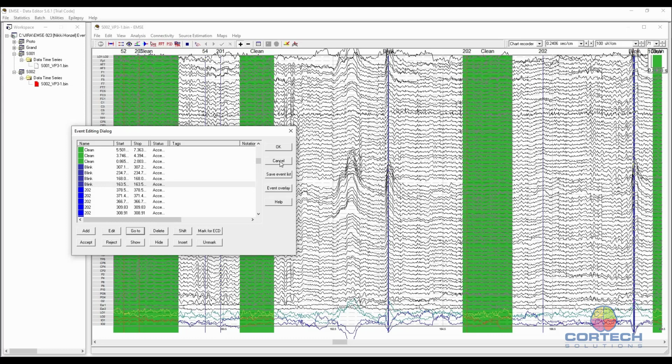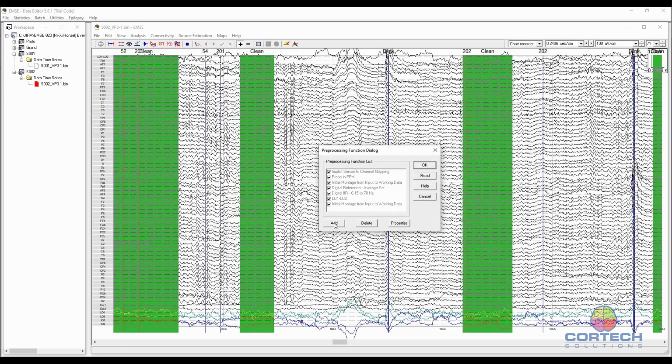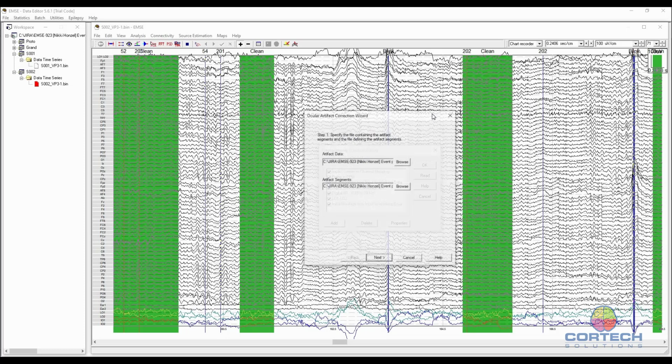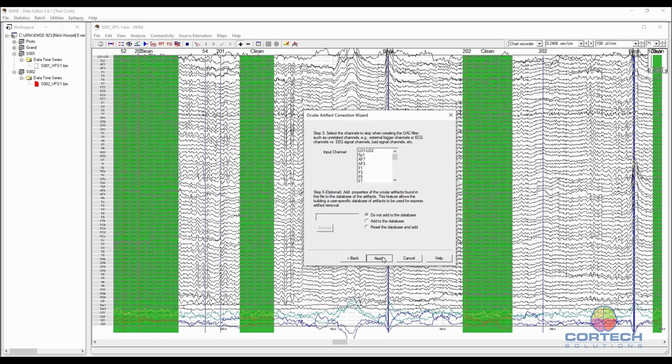Let's go ahead and do correction here. I think it's debatable whether we need to do that, but I'll go ahead and do it. And just like we did before, I can say next here. I can say blink is the artifact segment, clean, and next.